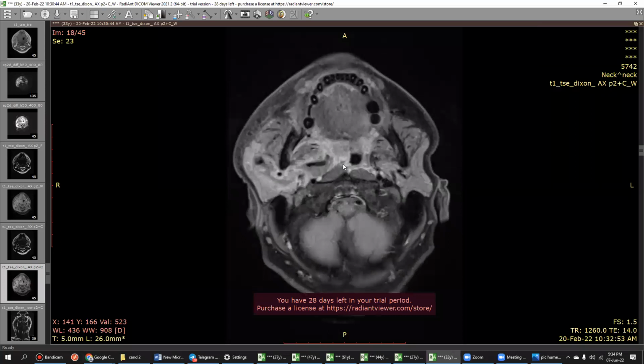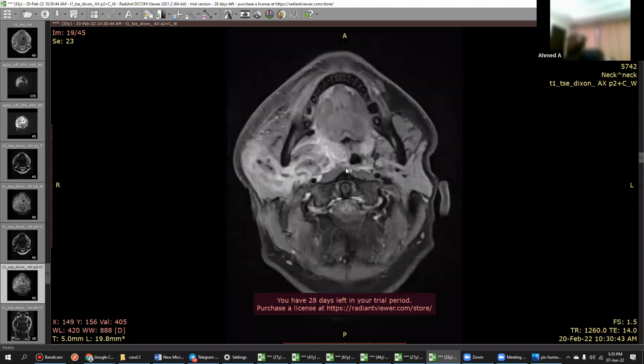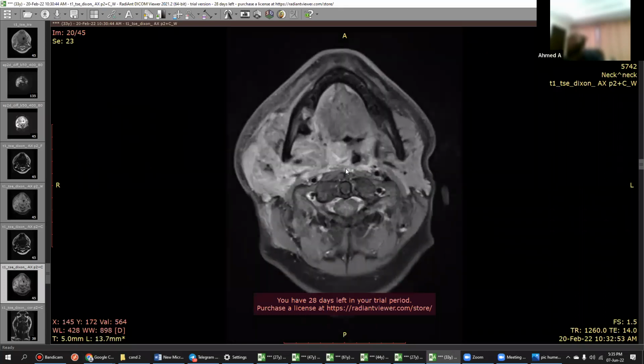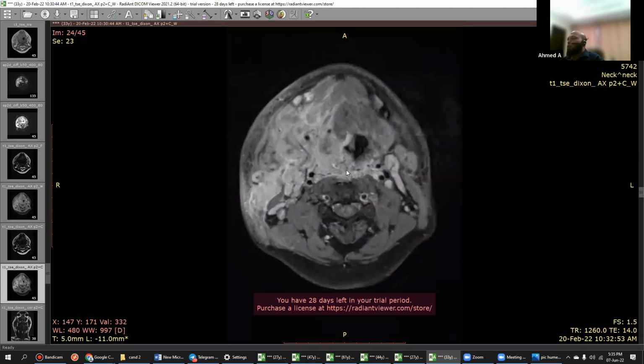The most important point which you have to tell the examiner is, I would pick up the phone and call the emergency team, because you have to secure the airway either by tracheostomy or by ET intubation. Intubation is difficult because you can see that it's very narrow. Most cases of Ludwig's angina go into tracheostomy. Ludwig's angina has come in the exam, so remember it. Any infection they will put, and this is an emergency case, so you have to be aware of it.